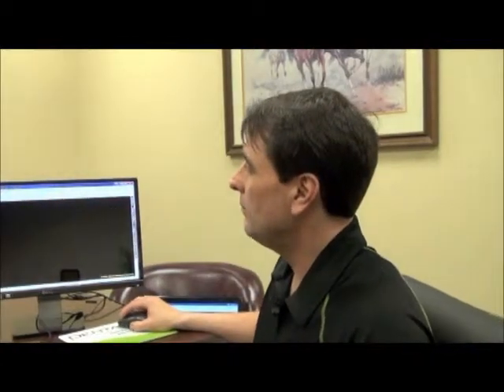Now we've covered everything from opening a patient in practice management to finding past images that were taken and displaying those, to taking single images and taking multiple images. And we've also covered how to print and how to export your x-ray images. We've gone over the tools on the toolbar, how to use the magnifier, for example, the spot enhancer, and how to darken images with the gamma correction tool. Those are the fundamentals. As long as you know those 6 things that we covered today, you'll always be able to replace your film with digital.